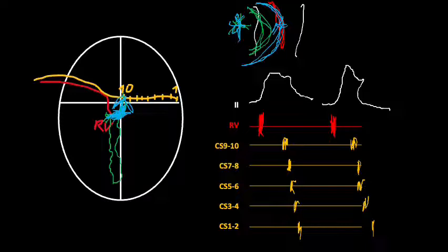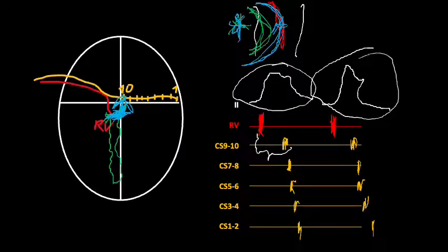So if we've got the difference in SA interval, so the interval between the stimuli and the first atrial activation, it's longer when we pace with the lower energy, so QRS complexes are broad, and then when we use higher voltage, QRS complexes are narrower, and this distance SA is shorter.